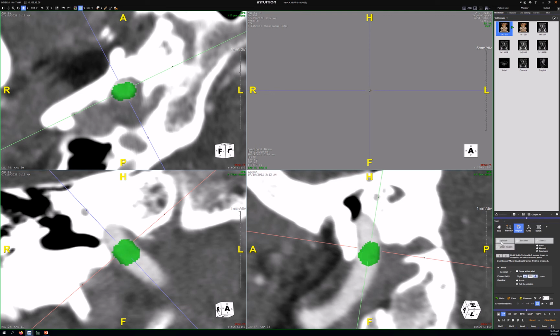Okay, so this seems really tedious. We're sculpting by hand, and although it's tedious, just imagine you were working for Bernini or one of these old-time sculptors.